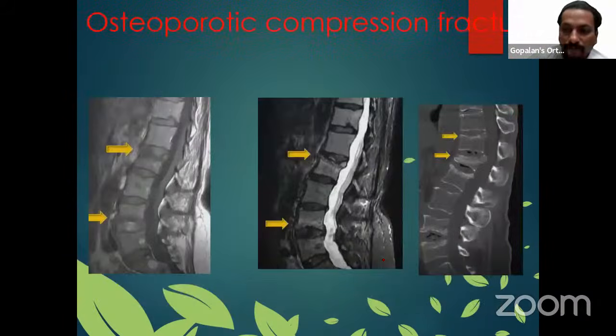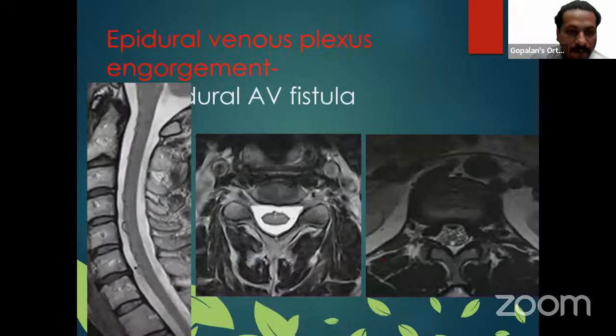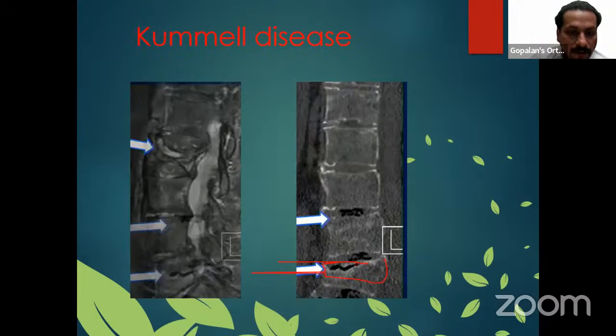Syed, can I interrupt if you don't mind? Yeah, sure. On the previous slide, when you said air, it's the black shadow, right? When you say Kummell's disease. Yeah. So, Kummell disease, osteonecrosis. Yeah, this is the black shadow there.